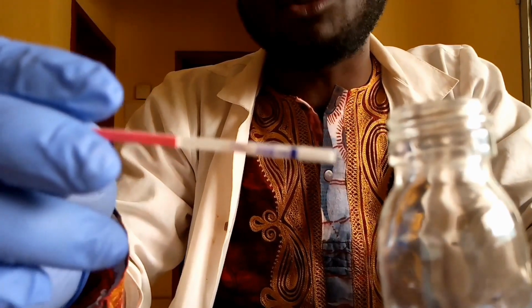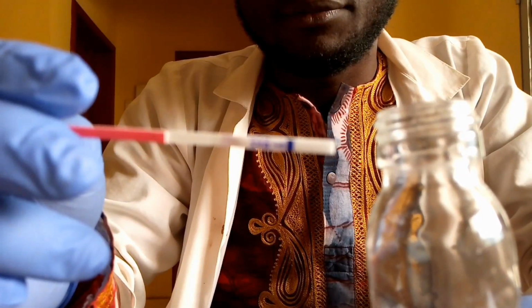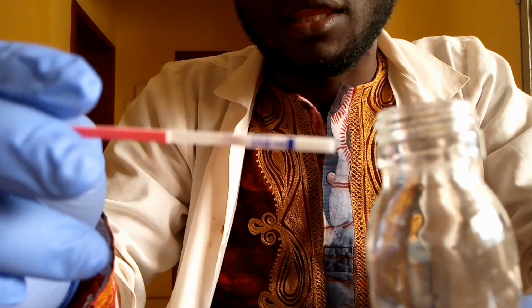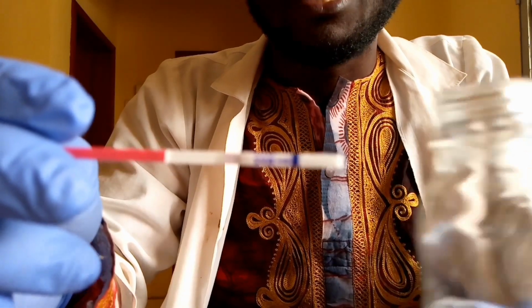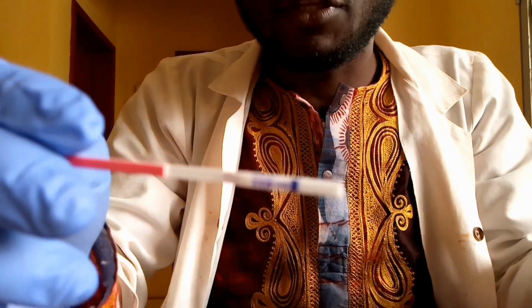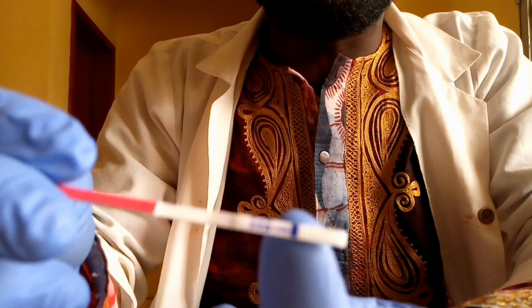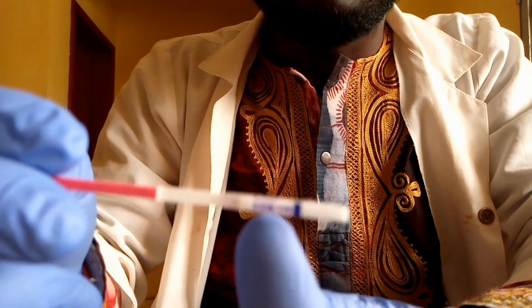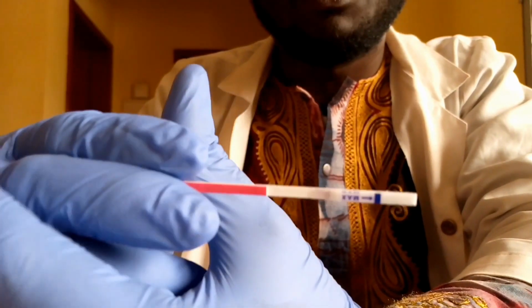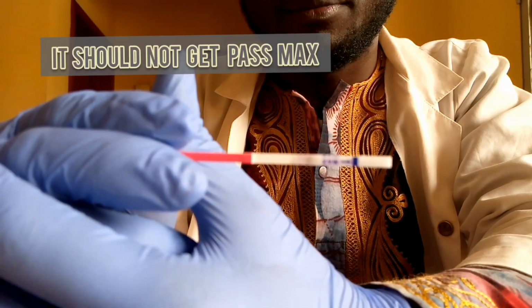So you dip this test strip in your sample such that you have it immersed, and take note, it should not get past the level where you see max. Max means maximum. So you should not get past that level where you have maximum.